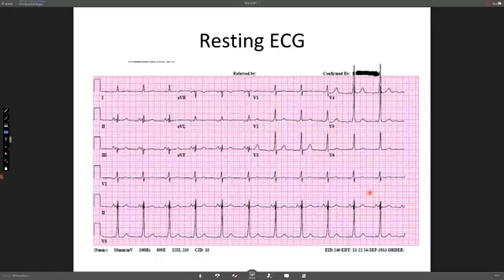While we're waiting for comments about this ECG, Dr. Mohammed Turki made a very nice comment, which I actually agree with. At the beginning of the ECG, it somehow looks regular, so whether this could be a flutter degenerating into AF. But one of the things we see sometimes when you have AF and it's fast, it can look regular, and there may be just very small variation. Eyeballing it, you think it's regular, but it may be irregular. Obviously, it's not uncommon for AF to organize into a flutter temporarily. So very nice comment, Dr. Turki.